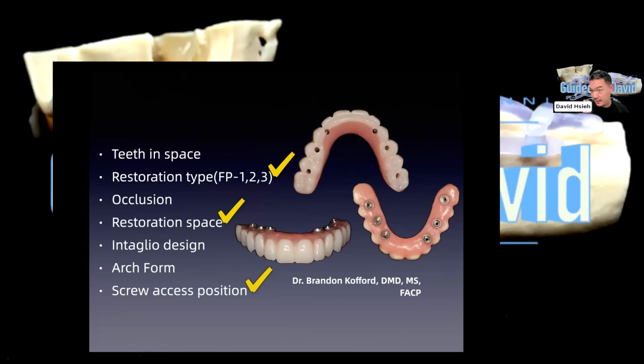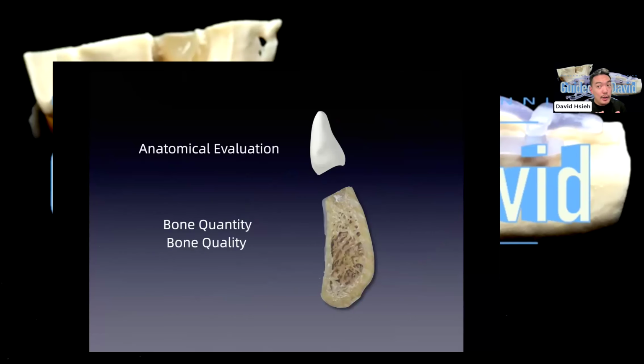And that's for restoration, so that's our restoration driven approach. We keep that in mind and then go to the implant planning later. Oral surgeons come here and say, the tissue is the issue. The space makes the case, but the bone sets the tone. So we have to know if the bone is allowing us to do such planning. The bone is still very important.